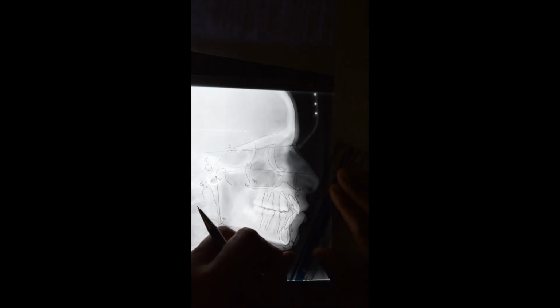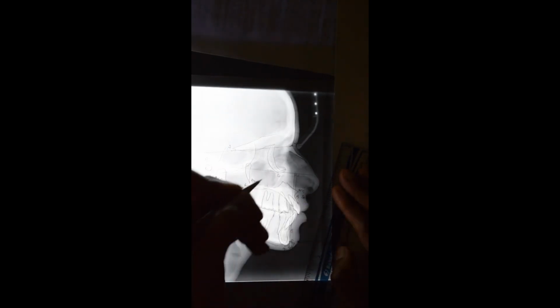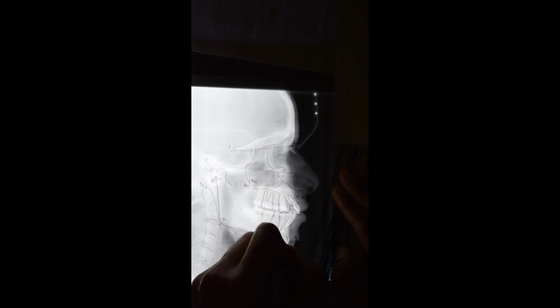And then placing the scale between the upper lip and the tip of the nose, we'll go straight deep inside, and this is where we have the subnasal. Okay, I'll write it over here so that you can see. This is subnasal and this is pogonion dash. So when I place a dash on pogonion, it means this is the soft tissue pogonion over here. As you can see, it's almost in line with the hard tissue pogonion.